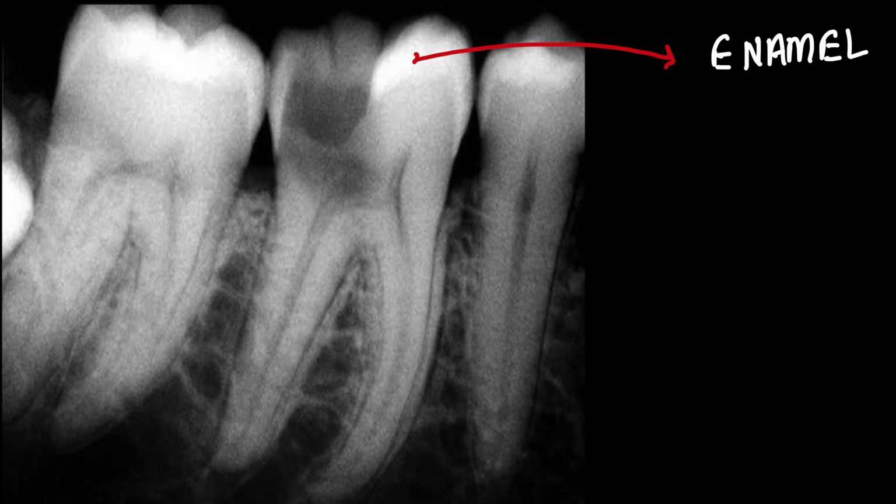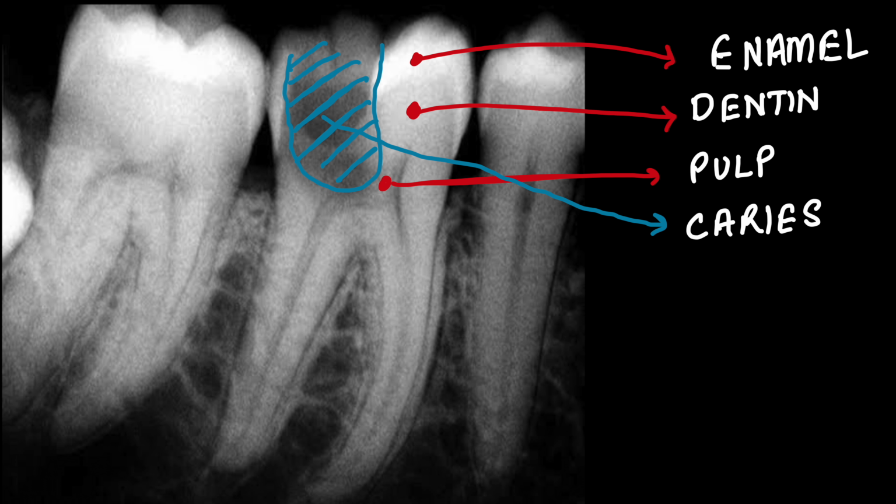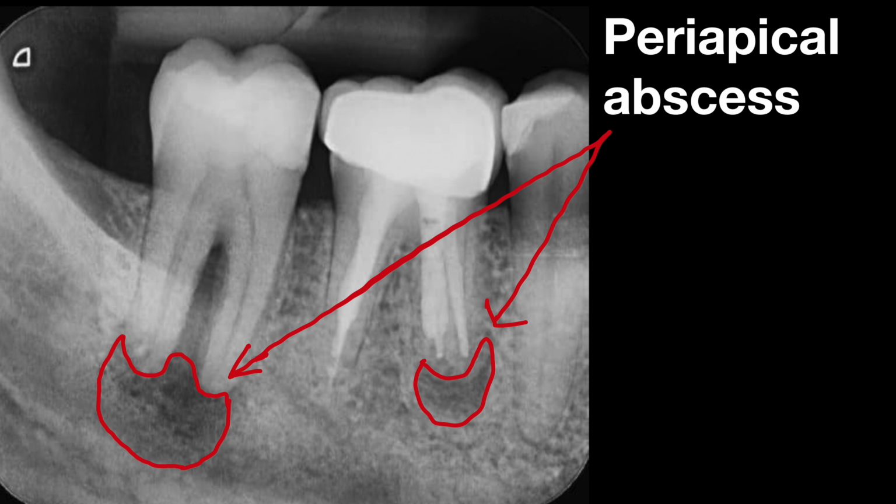But what happens when there's a problem? For example, in dental caries, radiolucent shadows invade the enamel and dentin, indicating mineral loss. Or in the case of a periapical lesion, you might see a dark radiolucent area at the root tip due to infection or bone loss.